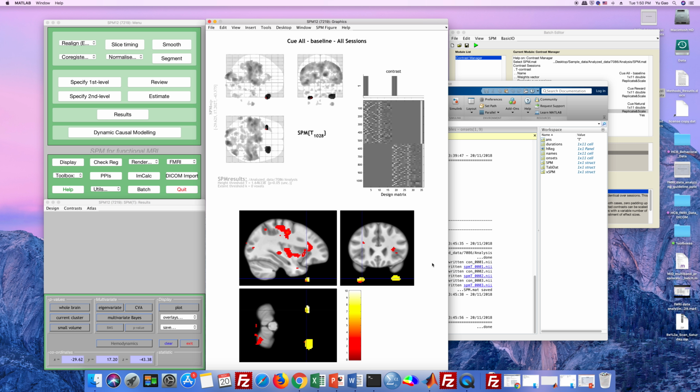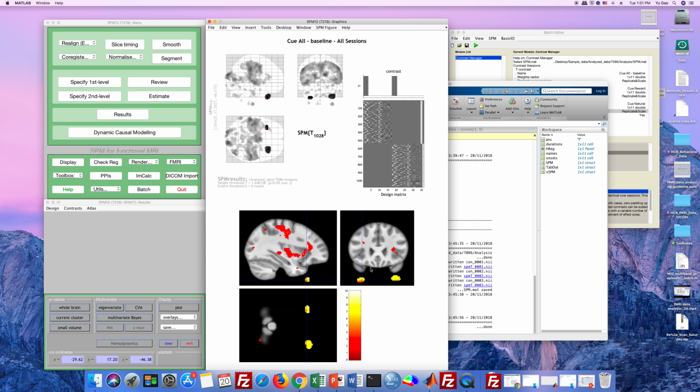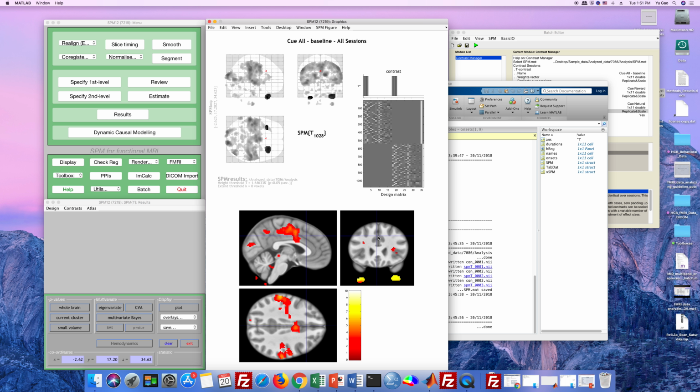Because for this video, this basic pipeline, I just do the very minimum, following the standard pipeline to do the data processing. I didn't control the activation outside the brain, but in my revised pipeline, I have more complicated processing and exclude those non-meaningful brain activations. So that's it. Then you know how.